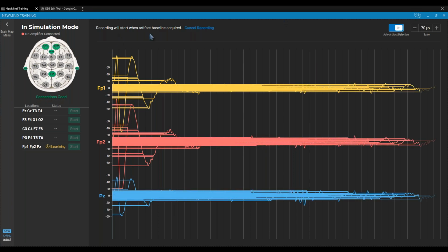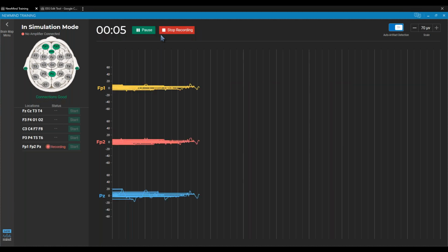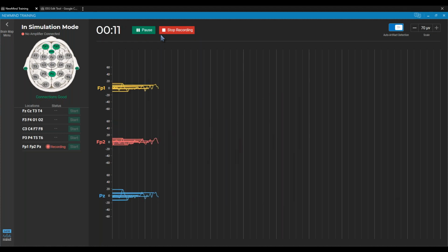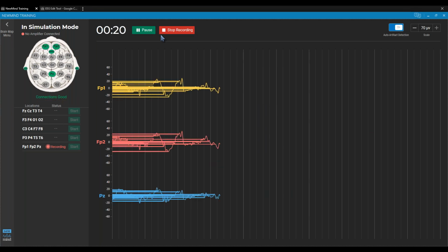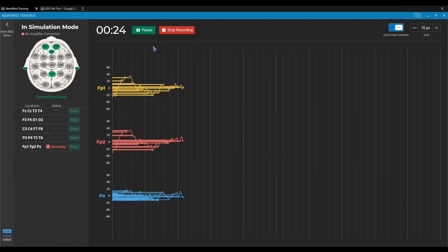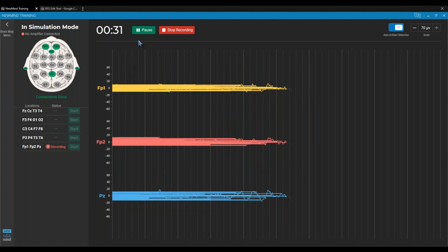I'm going to wait, first of all, and see how long it takes to acquire this baseline. Does it take 20 seconds? Does it take 30 seconds? Am I a minute in and the timer still hasn't started? If I'm getting close to a minute and the timer hasn't started, the software posts a message saying the baseline is taking longer than expected.